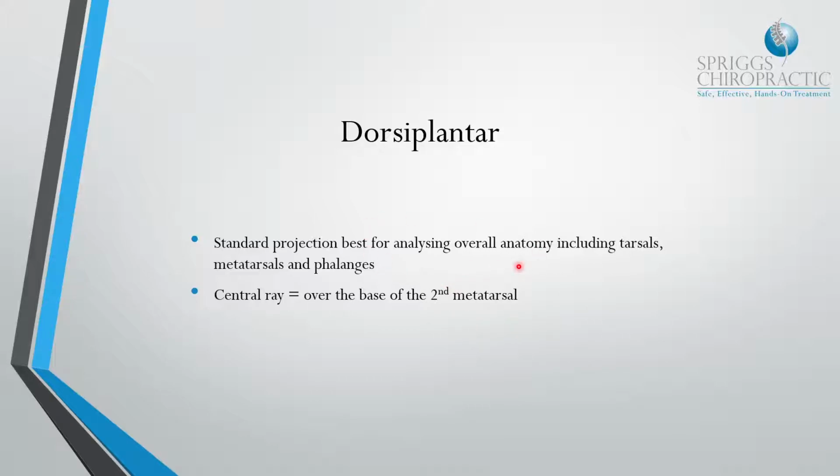But it's great for overall assessment of the foot and ankle, with Lisfranc's fracture dislocations being the main reason why you would obtain this view. The dorsiplantar oblique is then much better for evaluation of Lisfranc's fracture dislocations of the tarsals and metatarsals.